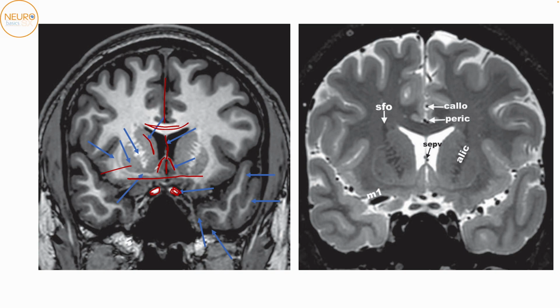And as we have discussed two or three times now, the caudate and the putamen are joined to each other inferiorly through the nucleus accumbens. Okay, and this will be the anterior limb of the internal capsule. The anterior limb of the internal capsule occurs at the level of the putamen and the caudate. The posterior limb of the internal capsule occurs at the level of the putamen and the thalamus. Okay, so at the level of caudate and putamen, you will get the anterior limb of the internal capsule. This here, after the putamen, is your external capsule, then your claustrum, and then your extreme capsule.